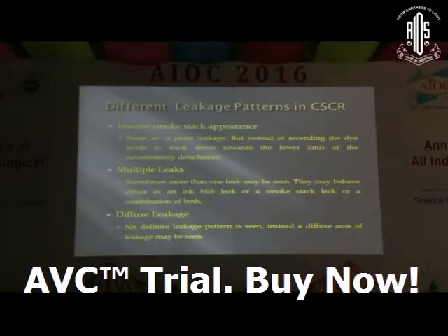In the reverse smokestack appearance, it is like a smokestack, but instead of ascending, the dye tends to track down towards the lower limit of the neurosensory detachment. You can also find multiple leaks. Sometimes more than one leak may be seen. They may behave either as an ink blot leak or as a smokestack leak or a combination of both.